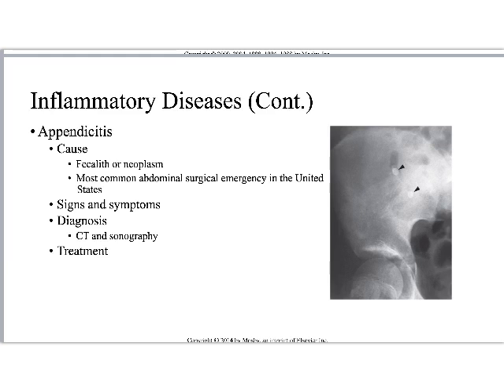Now, we've looked at appendicitis quite in depth when we talked about it in CT. So I'm not going to talk too much about the CT appearance of appendicitis. What I want to talk about is its appearance on X-ray, right? It is commonly caused by what we call a fecalith or an appendicolith, which means a stone made out of poop, right? That's literally what that means. It means poop stone, fecalith. Not good for wedding rings, right?